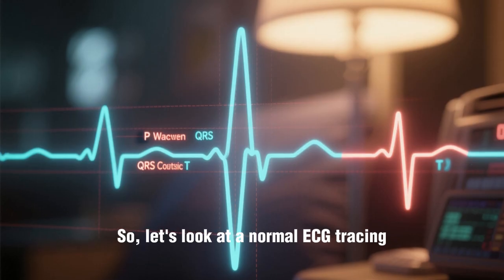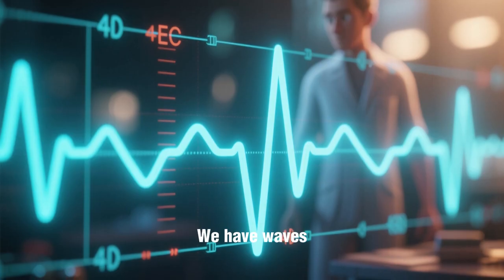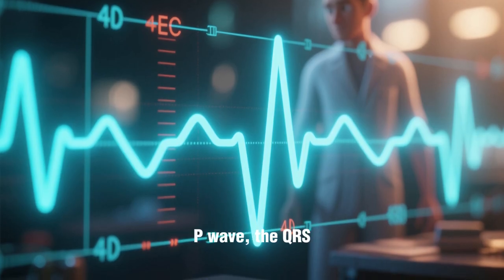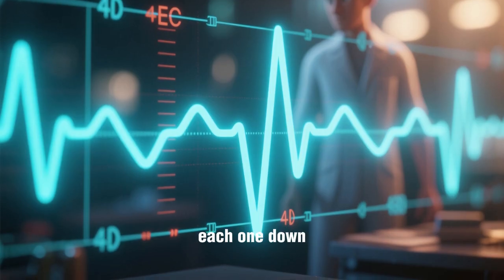So, let's look at a normal ECG tracing. What are we actually seeing? We have waves, segments, and intervals. The main components are the P wave, the QRS complex, and the T wave. Let's break each one down.